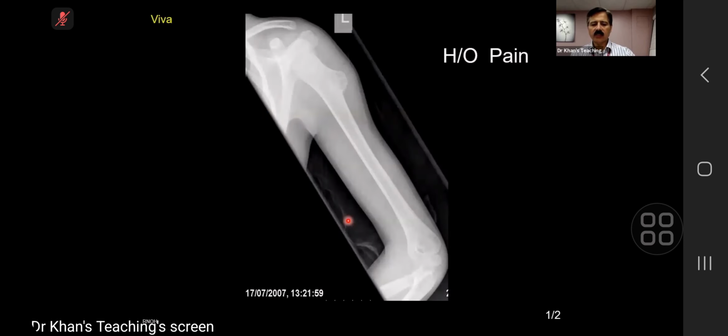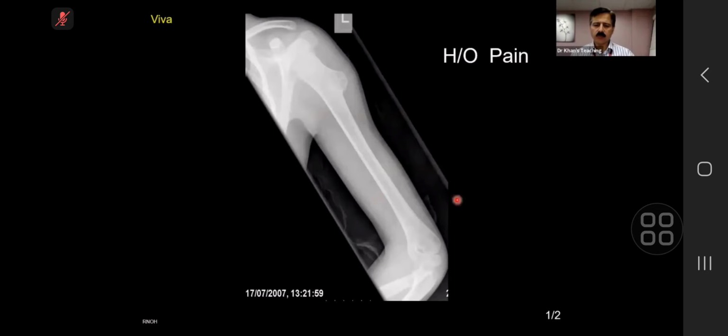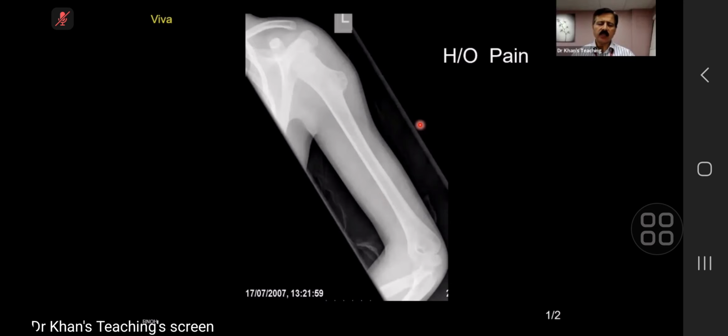This one. Okay, this is an exam film. Candidate 3, can you raise your hand, please? Thank you, candidate 2. Okay, so candidate 3, this patient has got an osteochondroma. We know that. The patient has presented with pain. They are worried. What will you do?